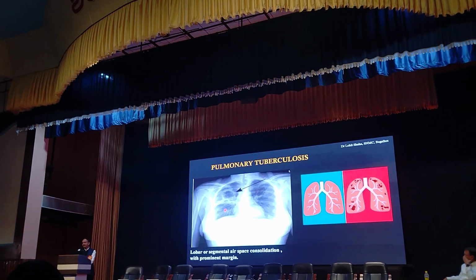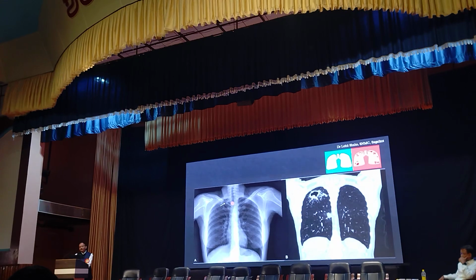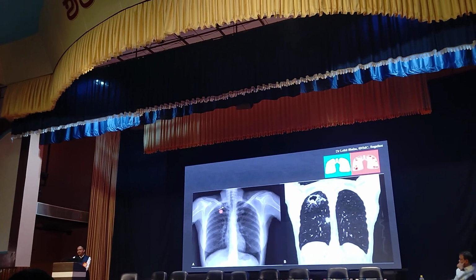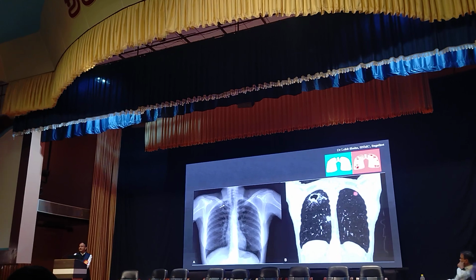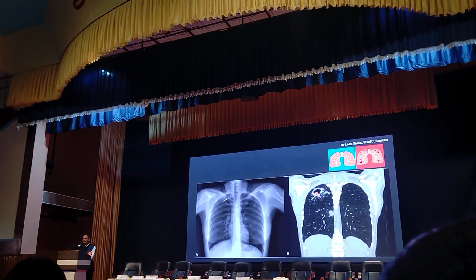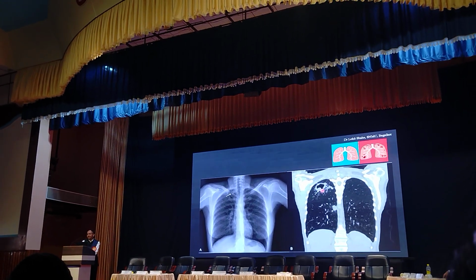In these cases we are going to find it like this. Even we can find the same case over here in the X-ray. To confirm it, we may advise a CT scan. In the CT scan also, you can find this air space with the prominent margin for confirmation.